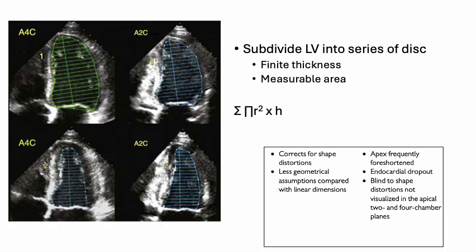Number two is things like LVH. So when you have very thickened LV wall, for example, and then this is diastole, and then this is systole, and then diastole, and then systole. What do you think the EF of that patient will be? Remember, EF is how much blood gets ejected out every time it contracts, right? So what do you think the EF will be? Poor, really? It'll be super good because it's so thick, right? The cavity inside your LV will be so small, and by the time it contracts, the cavity will be obliterated completely. So it's falsely good. But your LV is so thick and so unhealthy. So how does that normal or supranormal EF value reflect that unhealthy LV? That's why we have problems with EF lah, because it's not truly representative of systolic function.